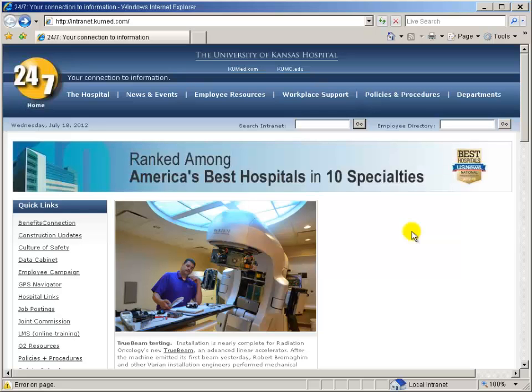The first topic is software. This one's pretty easy. MIRC can be accessed by any hospital computer that has access to hospital resources. It's also possible to access it remotely from outside the hospital, but we'll talk about that later. All the software needed should have already been installed by radiology IT personnel, so consult them if you have a problem. The only exception to this is if you want to annotate your images, there's an extra piece of software that's needed. But we'll cover that in the annotation tutorial later, because it's not required now.